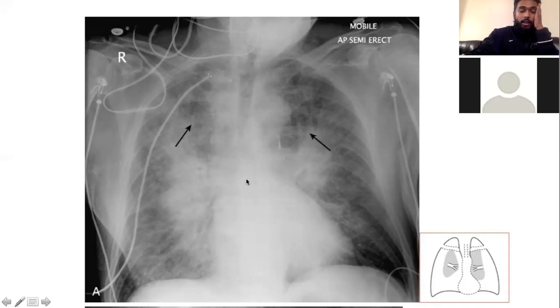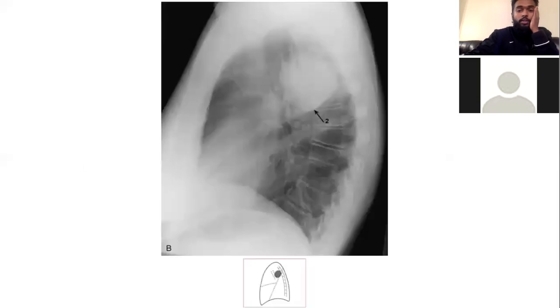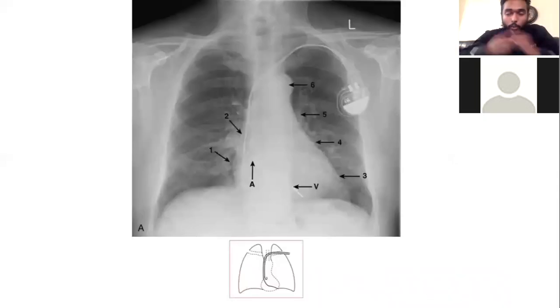Another thing is if you look at a regular chest X-ray, it goes along what we just said. Where do you think the vessels are going to be more dilated and prominent, up or down? Down, I would say, because there's more blood flow there, because of gravity. And if there's more blood flow, there's more oxygen. So what happens to those vessels if there's more oxygen? It's just the opposite of what you said.